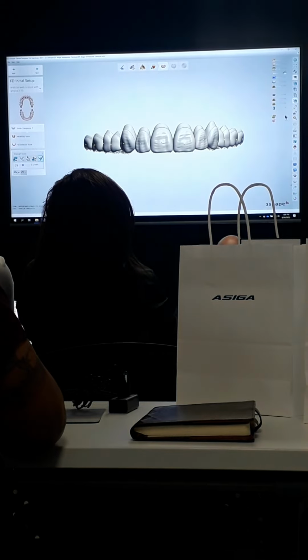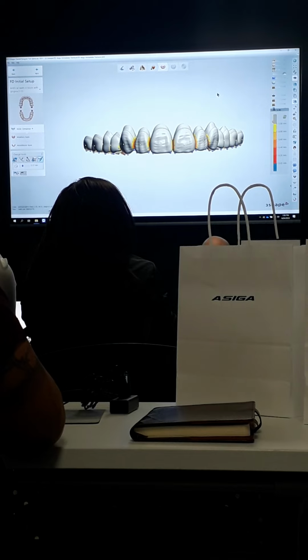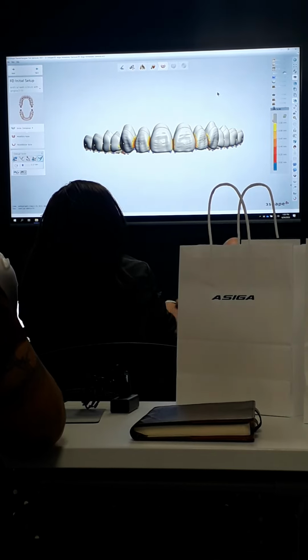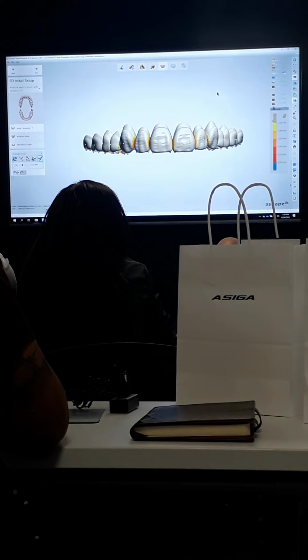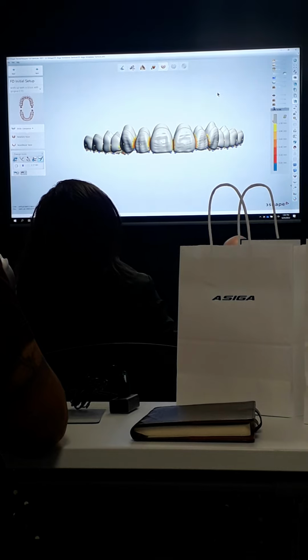I use the one above that. So that's your occlusal map. Does anyone have experience with our crown and bridge software, designing just regular crowns? The occlusal map there is a color code that shows you distances to the opposing and adjacent teeth and things like that. Well, this one is actually a combination of two sliders from the crown and bridge software. The first is the occlusal map. The second is the collision lines.